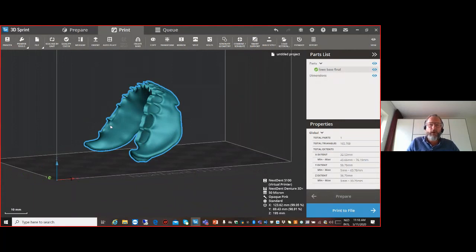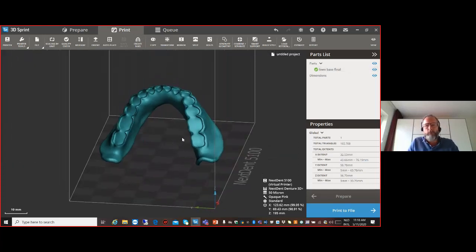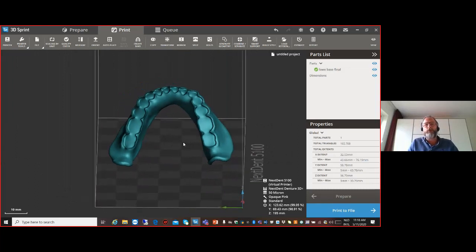And we've also found that by creating support bars, you will have a more stable, robust build, and therefore a little bit more accuracy of the end part. Now, we're not talking about huge differences. The current build style works perfectly fine, but we are aiming to achieve the highest possible. And we found that by creating support bars, it will get a slightly more accurate end part altogether.